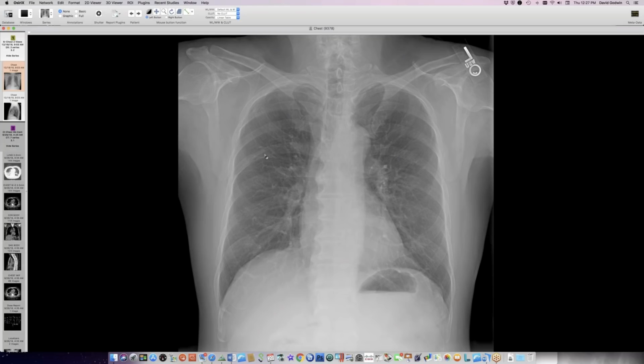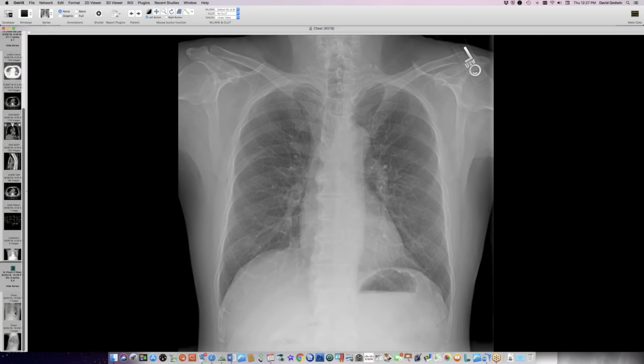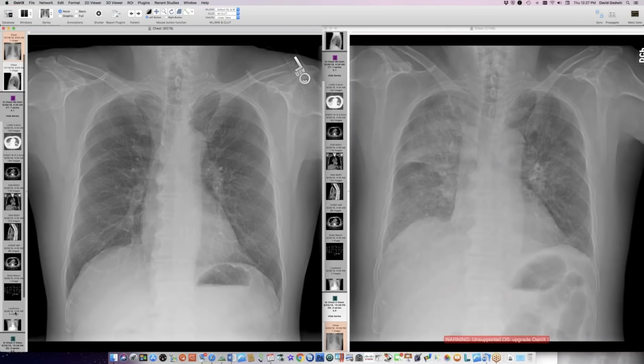So very nice. David, can you leave this one up and put that initial radiograph alongside it when he had the consolidation next door to it? Yeah, I think if you look at the right-hand side, thinking about overhydration, he definitely weighed more on the right-hand side than the left-hand side. He's got tremendous generalized subcutaneous soft tissue edema. So I think they probably did give him a lot of fluids. He's got a lot of extracellular, extravascular water in his chest. So the thought of pleural fluid goes along very nicely with that too.